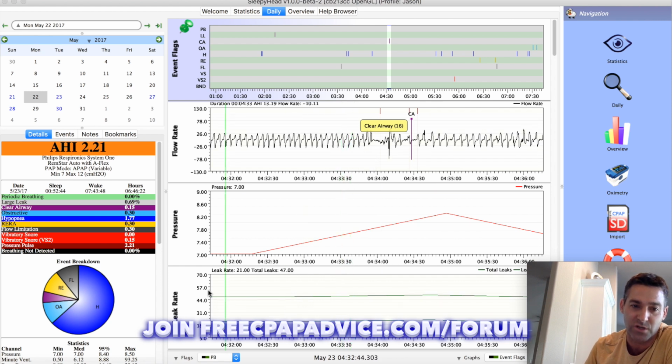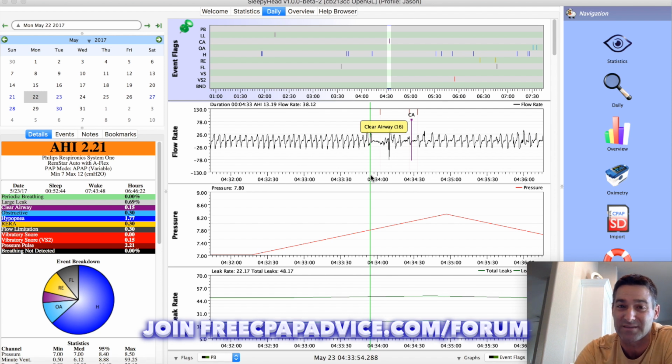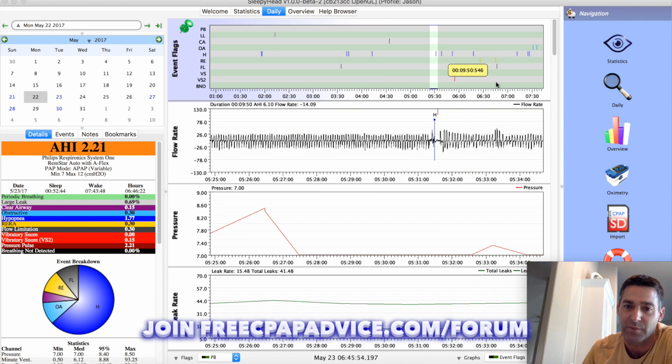Now, what's also cool is you can correlate this with leak rates. So you can see the pressure is increasing here, but what if the leak rate spiked right here, right before someone wakes up? Well, then you know it's probably because there was a leak out of the mouth or the mask was leaking, and that's what caused the awakening. So you can use this green line to line stuff up and see if there's any other explanations for a sleep apnea that's causing you to wake, or a hypopnea or anything.